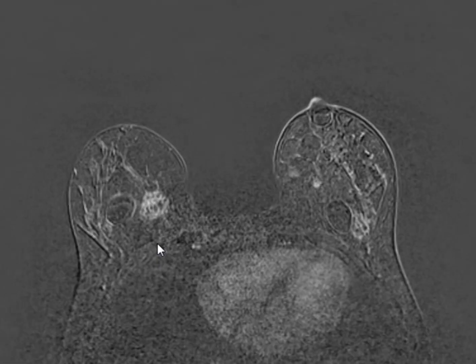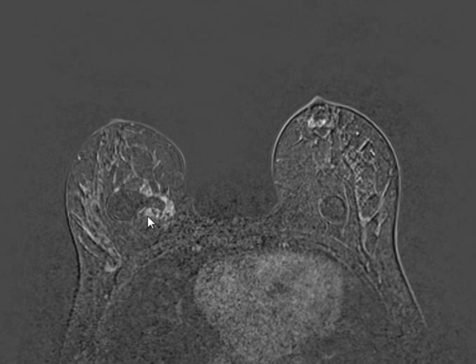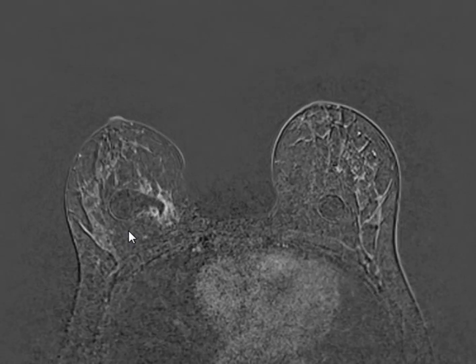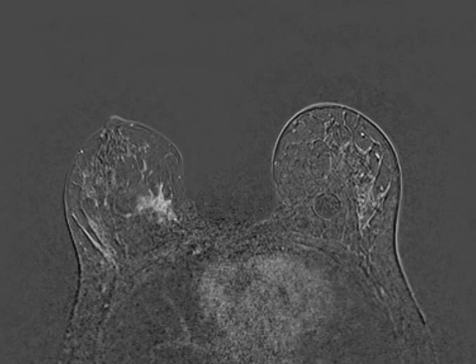Non-enhanced. Just the patchy parenchymal enhancement here and there. Maybe this one is related to this cyst. You see, it's like that, and it's causing some inflammatory or, I don't know, irritation in the adjacent breast tissue. Compression, possibly. I don't know. So now, in order to not waste time, let me show you something.